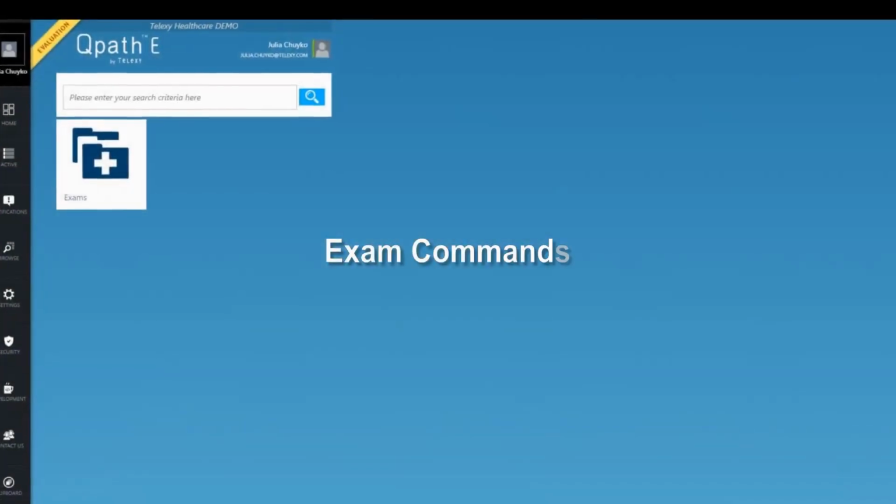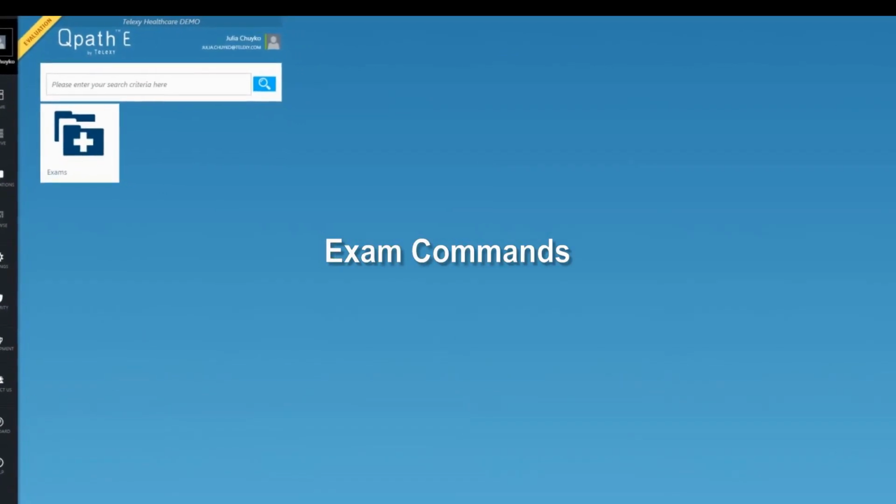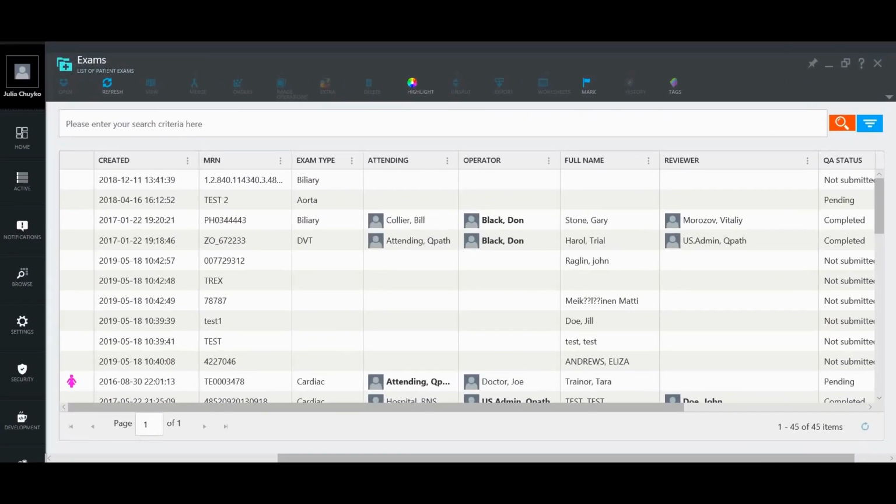You are watching Qpath E demo. In this video, you will learn how to use and customize the exams command section.